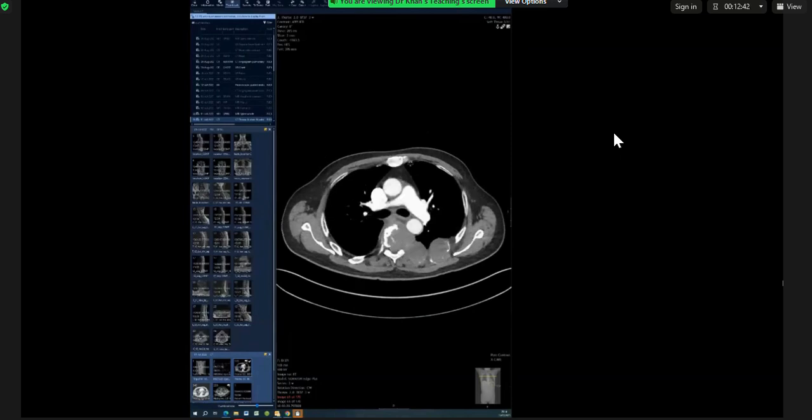And you have to always think of the spine, because you always want to not miss the thing that keeps the patient safe. Don't want to get everything right and miss the spine bit. Yeah. Because that makes it hard to then give you a high score on a case. Very well done. I will give you a harder one.